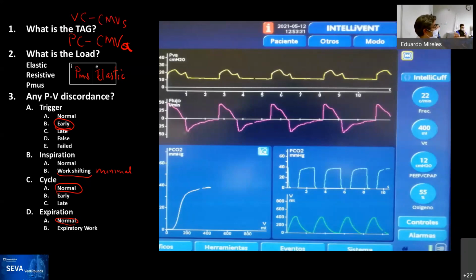However, I know why you went there, and I want to talk a little bit about it. You looked at the pressure waveform, right? And you see the deformation, but we know that ventilators are not good pressure controllers, so deformations are common even if you're pressure controlling. But you saw the flow waveform and you said, this doesn't look like a geometric shape, right? That's exactly what happened.